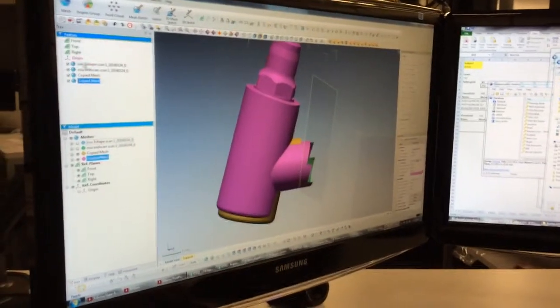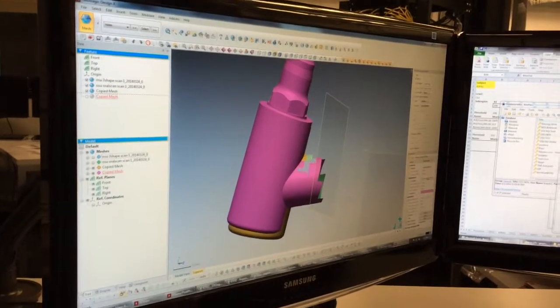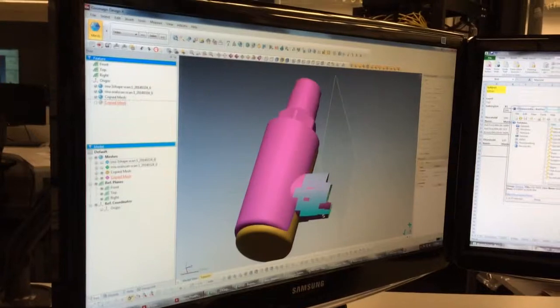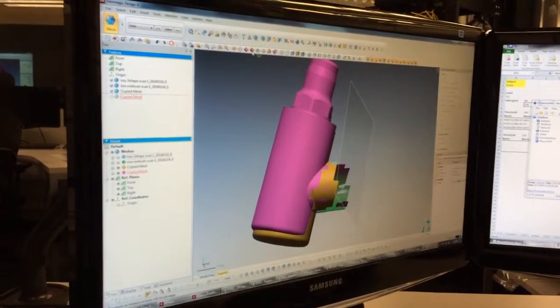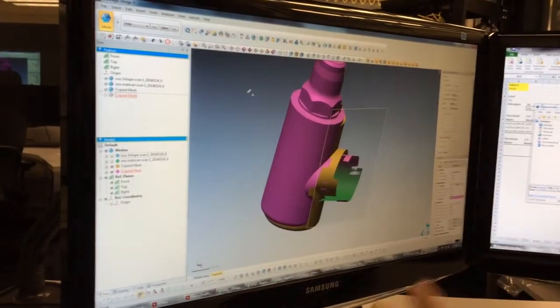I could have been a lot more careful about this. You can go in and do the same thing with precise selection. You can cut it like this, and because this came from a CAD file, it's such nice geometry. Everything is very easy, and these shapes are nice. But yeah, if you wanted to do deviation, you could then do that.